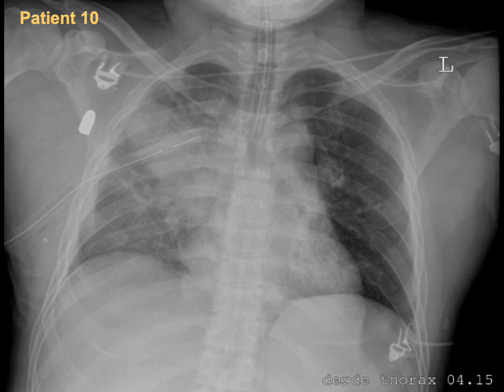X-ray of an 18-year-old patient who was in a fight with weapons. Airway centralized. B on the left side is okay. B on the right side, well, we have a heterogeneous whitish opacity in the middle, so this is most probably a lung contusion. Diaphragm here. Okay, and the right side is higher than the left side. This is normal, as we know.